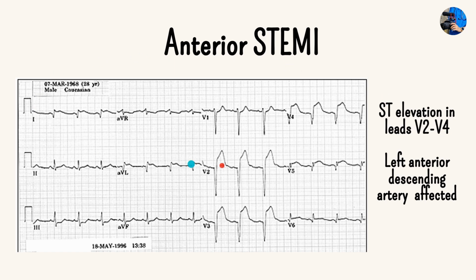Looking at this ECG, we can actually see ST elevation in leads V2 to V4. Have a look at that. That is raised above baseline. That's not how it should be looking, and that's running from V2, V3 and V4.